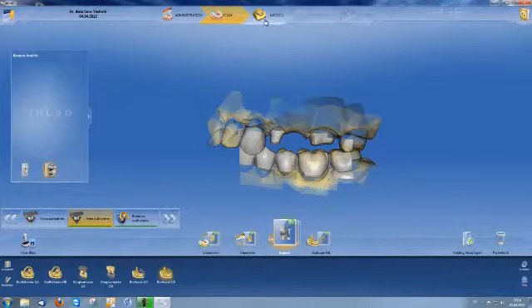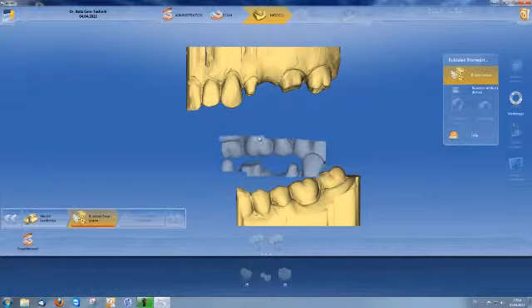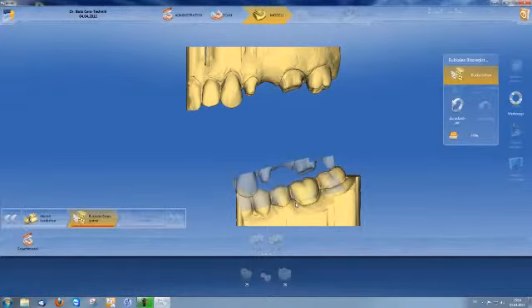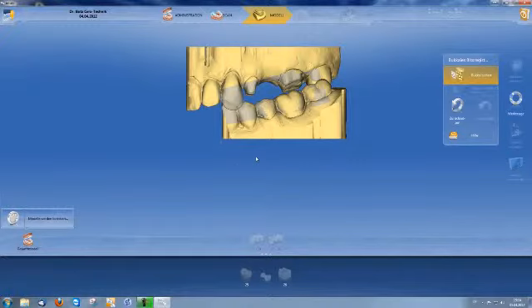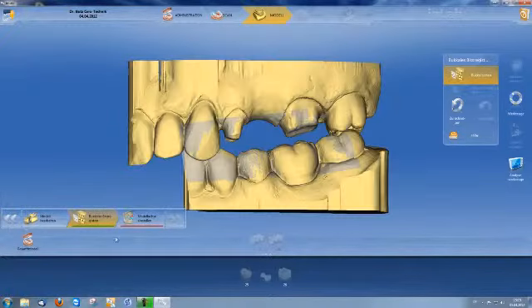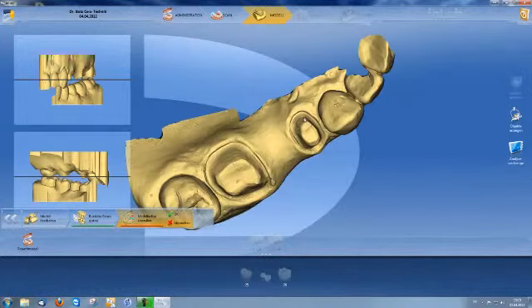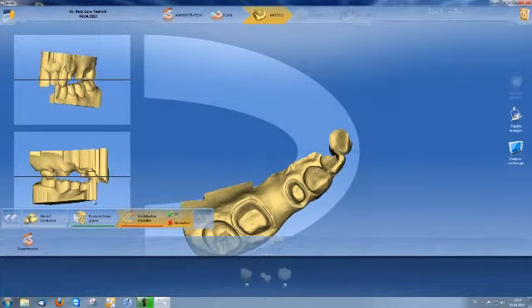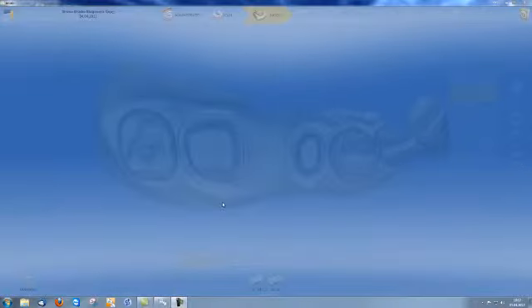Once all scans have been concluded, I come to the model stage and can now register the buccal scan. Using drag and drop, I move the scan to the areas where my model lies, and the software registers this automatically. I then go to Model Axis Setting. I perform mesial and distal alignment along all 3 axes. I confirm again by pressing OK.